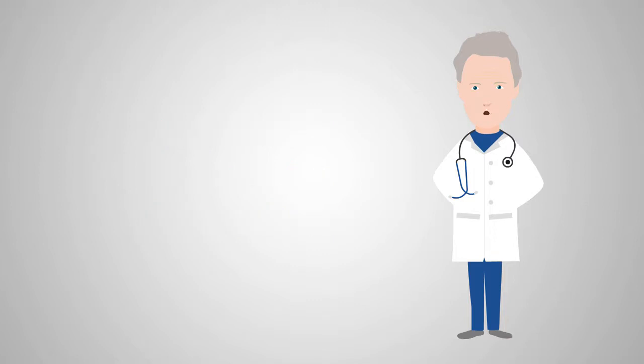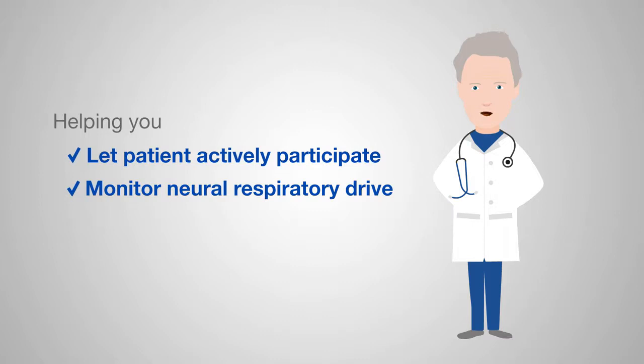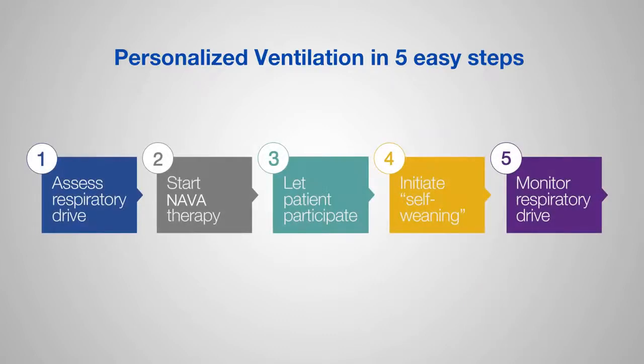My 3 imperatives for successful ventilation are: let the awake patient actively participate, monitor the neural respiratory drive, and have easy procedures that everyone in your team can follow. Let's look at how personalized ventilation works in 5 easy steps.